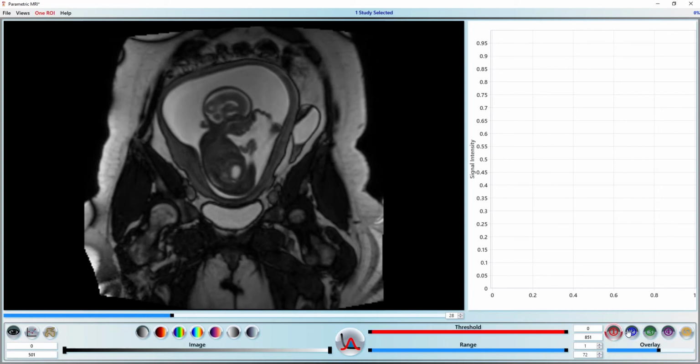These are selectable by the ROI toggle buttons. Let's use the default ROI 1 for the examples. There are also 5 different region of interest tools. Click the Draw ROI Mode button or press 3 on the keyboard to turn on the ROI tool.